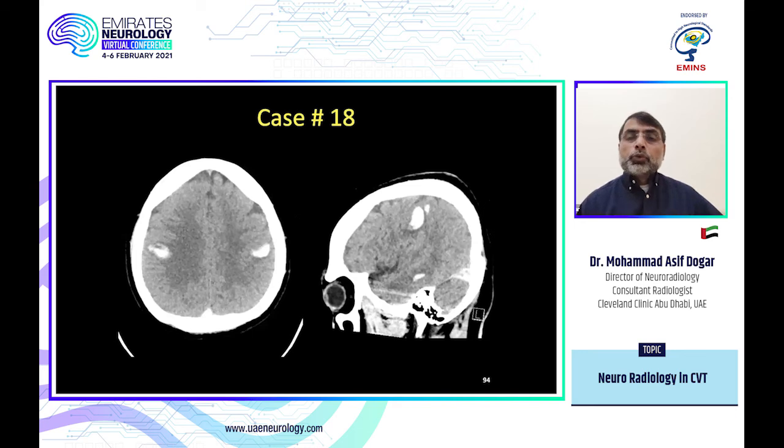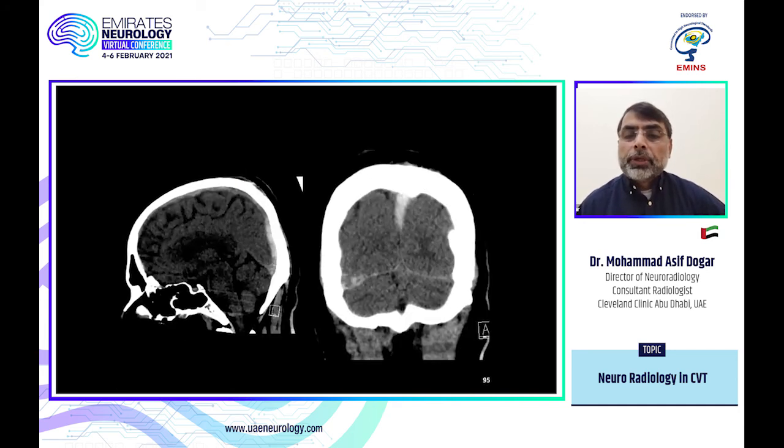So case 18, we'll go quickly through these cases. So these are bilateral hemorrhages. So when bilateral hemorrhages, look at the superior sagittal sinus. So here it's hyperdense posteriorly, normal density anteriorly. Even this transverse sinus is hyperdense. And again, our friendly coronal image shows you the sagittal image.